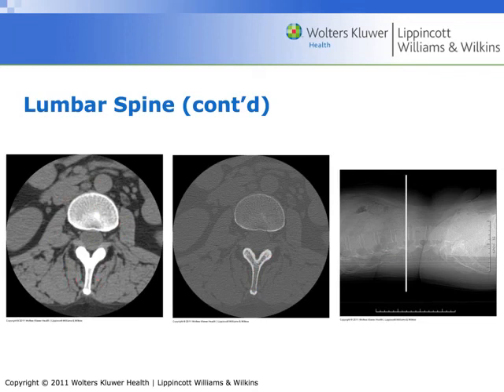Along the spinous process on either side, we have the multifidus muscle. Erector spinae muscles on either side of that. Patient's right kidney. Little dots on either side are actually exiting nerve roots. And if you can see this little change of attenuation here, this little gray line here, that is the posterior longitudinal ligament.